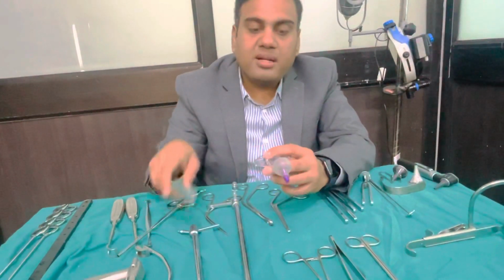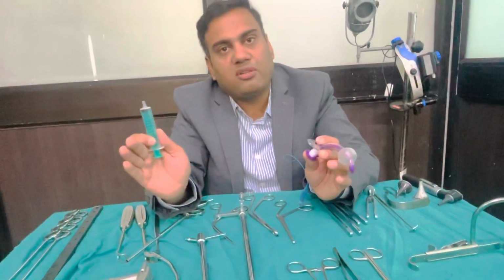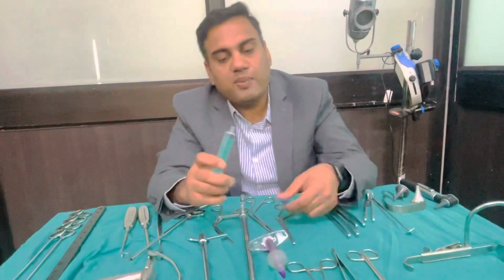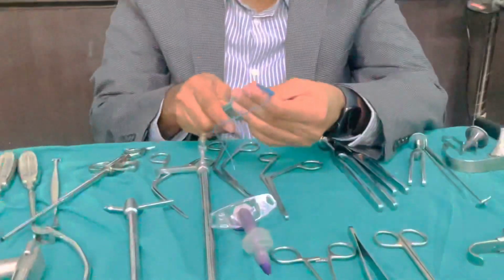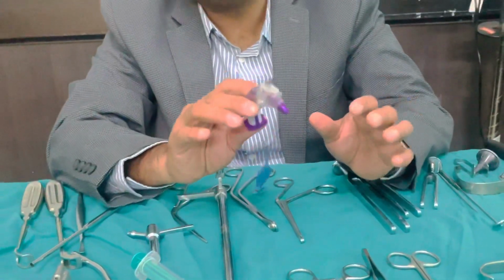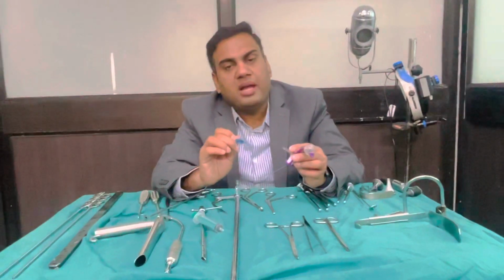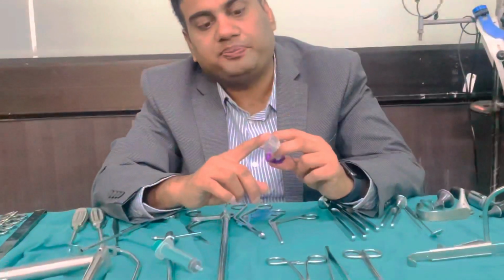But the disadvantage of this cuff is that it causes a lot of pressure on the walls of the trachea, and this may cause pressure necrosis of the tracheal wall or cartilages. That is why it is advisable to deflate this balloon in a timely manner. Especially when the patient is stable in the ward or in the ICU and the tracheostomy tube is in situ, every 2 to 3 hours you should deflate the cuff. But during feeding of the patient, it should be inflated so that there is no aspiration.